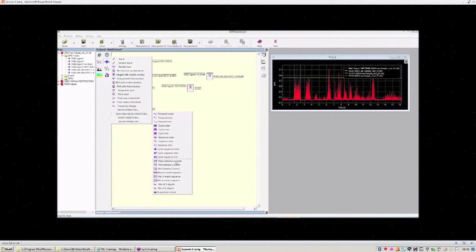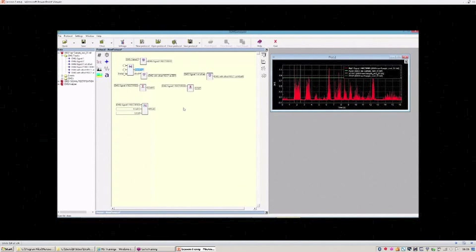Now we can also compute the mean between the two events. And again, the input, the first is the rectified signal, the second the start event, and the third the stop. Okay, and now we can also add to the graph also the mean value of the signal. Okay, so this is just an example about the two operators available into the Smart Analyzer application to perform the full wave rectification of the signal.